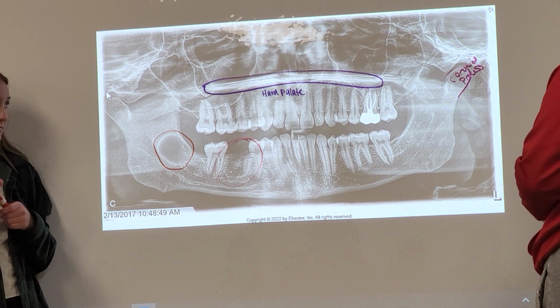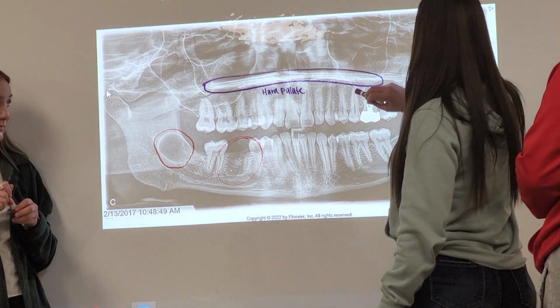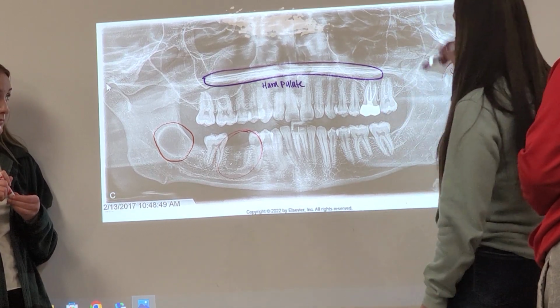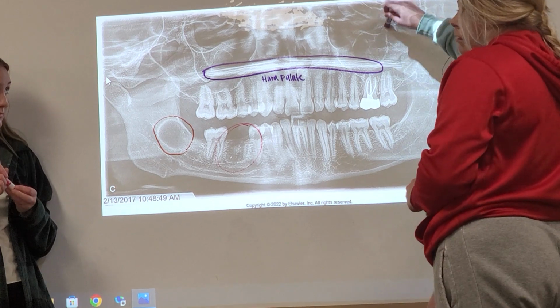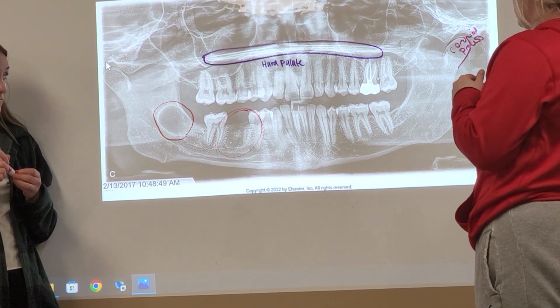Okay, Brooke, where is the maxillary sinus? The maxillary sinus would be here, right? And then where's the zygomatic process? Yes. Everybody agree with that? Yep.